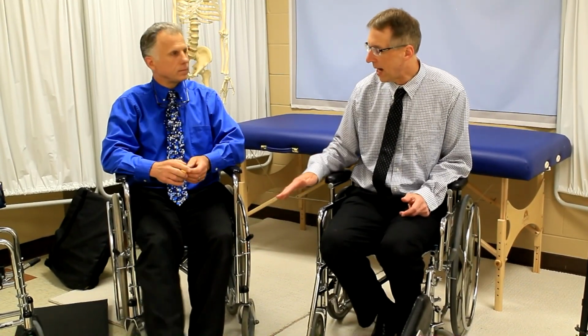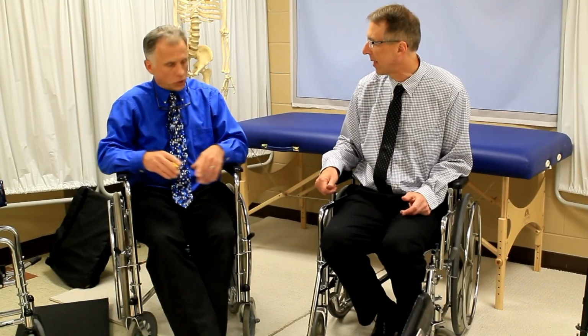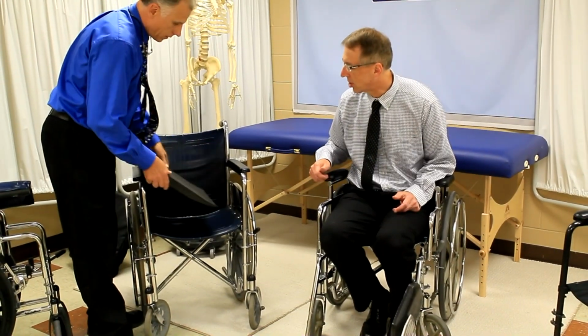Now, for a lot of people, you're going to want to get the lower chair for this reason. Brad, do you want to put those two things back there? Brad, how tall are you? 5'10", a little under. So Brad's not short, he's about average height.